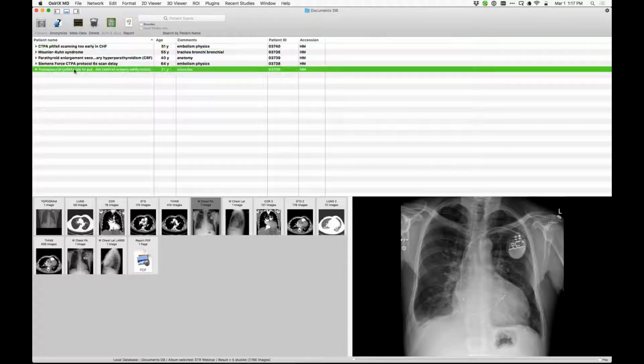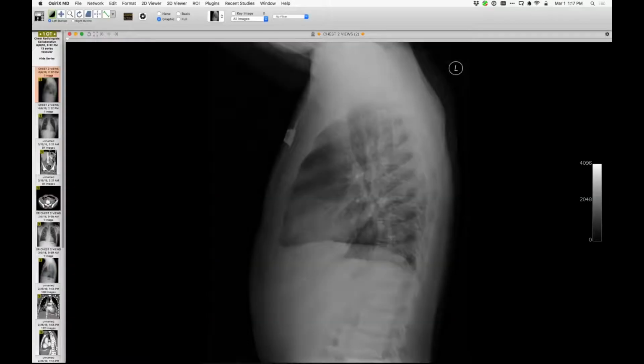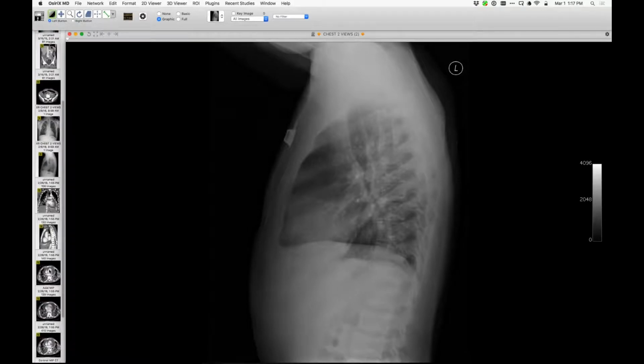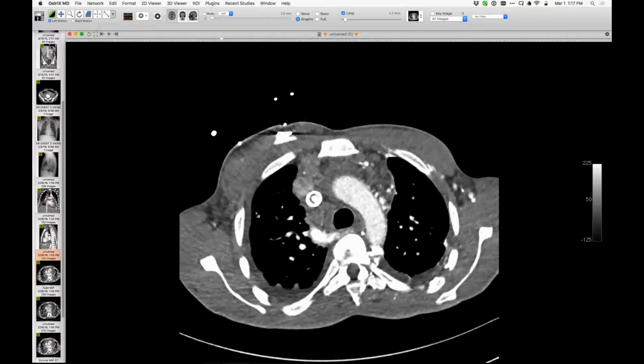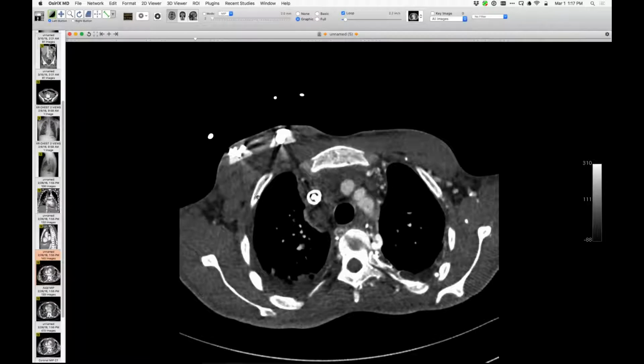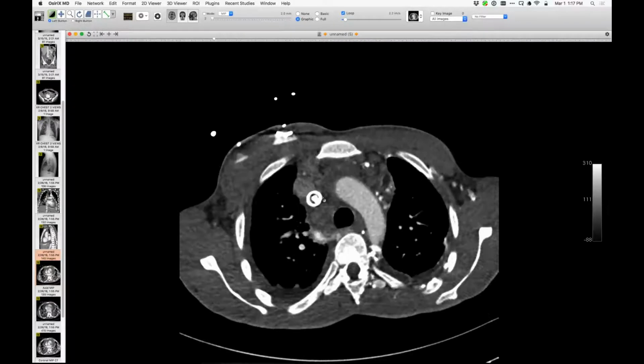All right, let me show you an interesting case we had the other day. So this is an unfortunate young person with sickle cell disease, and he's pretty ill. He's got a lot of things going on. He's got pericardial disease, but he also has central venous obstruction. And as far as I know, I've got some of my residents here, the central venous obstruction has been ascribed to central venous thrombosis from catheters.